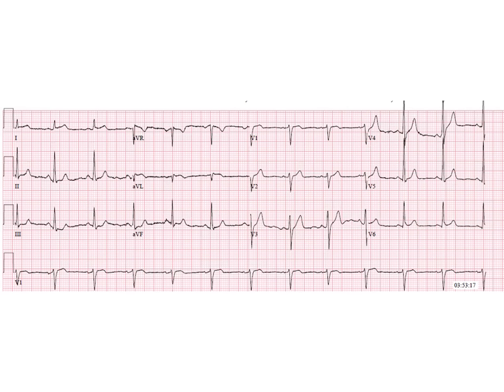Some medical students really get scared when they see V1, V2, V3, and V4 because they see that the ST segment might be elevated, but I was lucky enough to do a rotation with a really great cardiologist when I was a medical student. Basically what he told me is that from V1 to V4, those ST segments are going to get a little bit bigger with each successive lead. So don't be scared. If it's rising proportionally, then it's normal. If they're super off the page, then obviously it's going to be abnormal. And we'll get into all that as we go today.